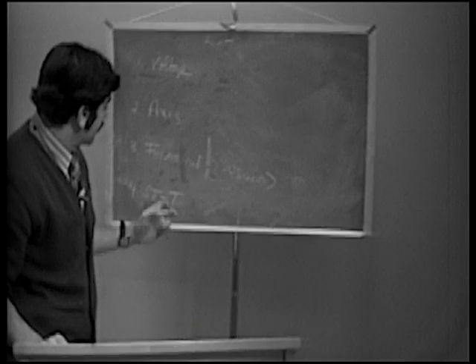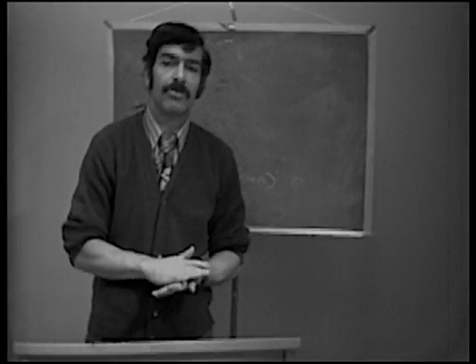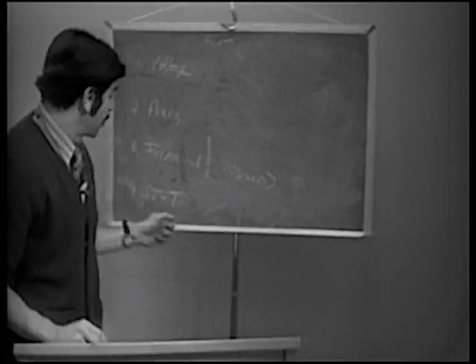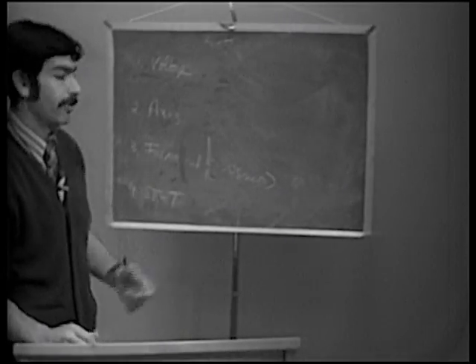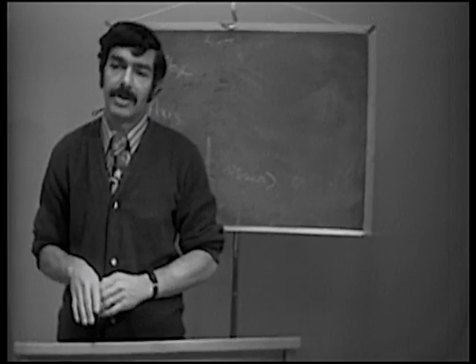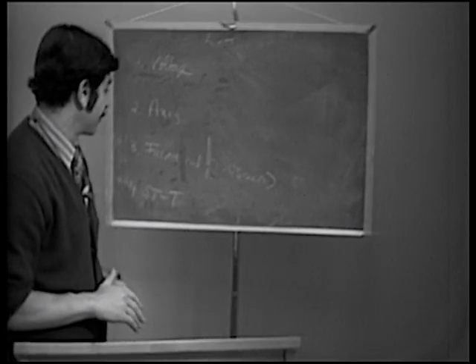Now, it's also said that these ST-T wave changes have some prognostic significance. And it's said that patients with hypertrophy in association with ST-T wave changes have a prognosis of under 5 years, probably on average. It's just probably an average value.